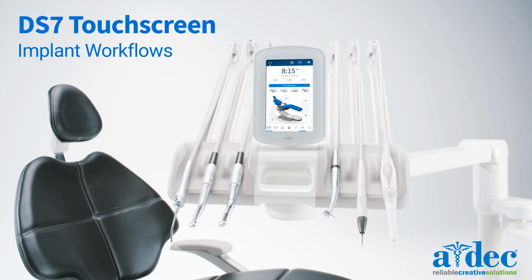In this video, we will discuss using implant workflows on the DS7 touchscreen. Workflows allow the user to use predetermined settings at different steps of the implant procedure.